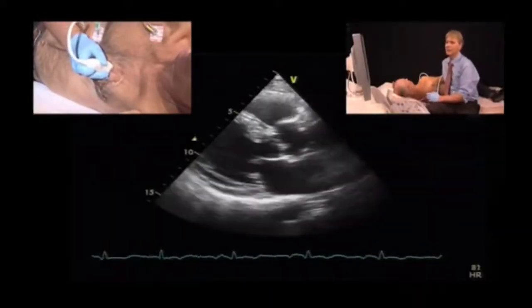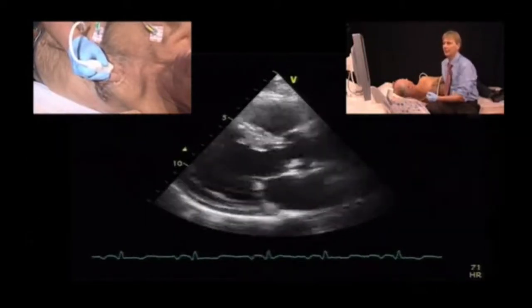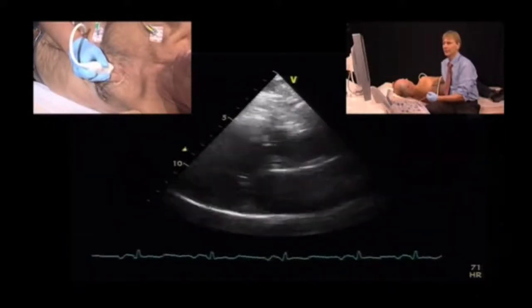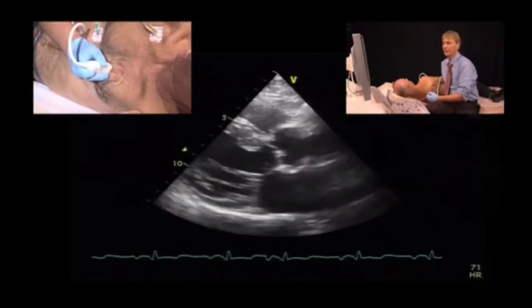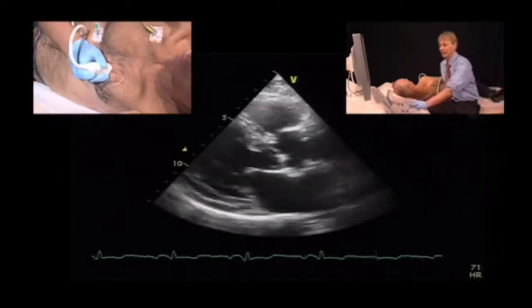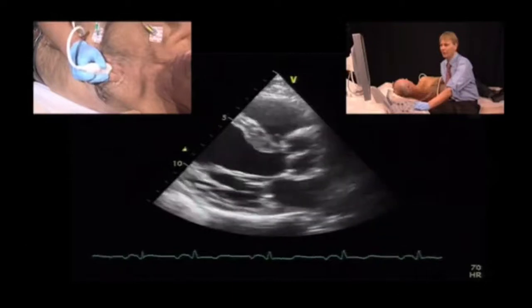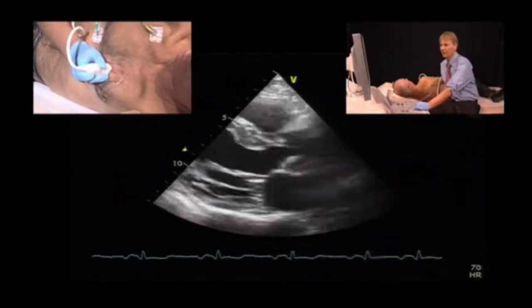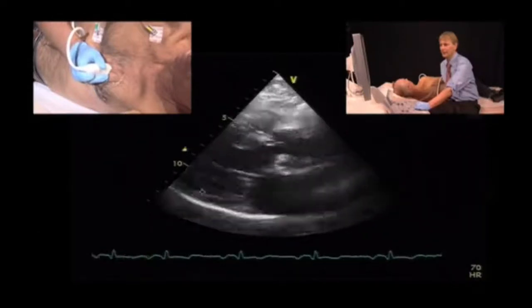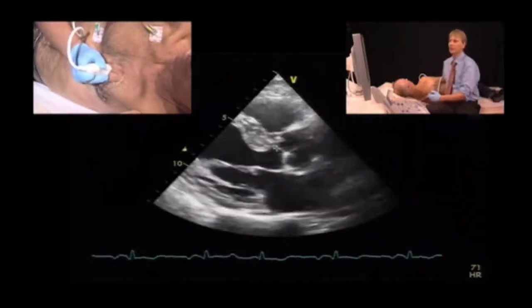This is the parasternal long axis view, and what we appreciate is that the patient must also have other risk factors, hypertension, simply because there's left ventricular hypertrophy, there's also aortic valve stenosis, and we also see degenerative changes of the mitral valve apparatus. But what we also see immediately is that there's a scar here in the posterior wall. The wall is thin, does not contract normally, and there's also more echogenicity within the posterior wall. The remaining portions, as far as we can see them in this view, seem to be normal.